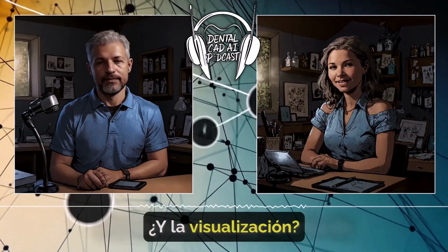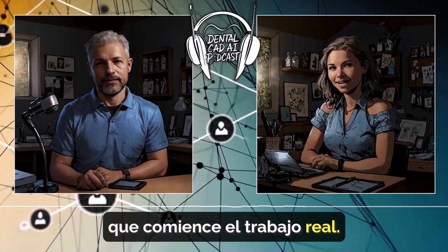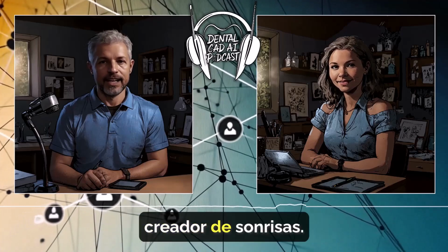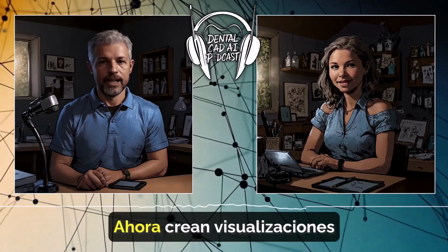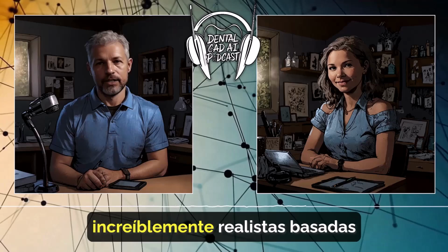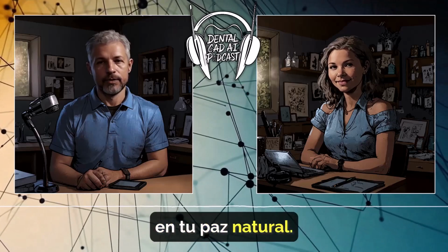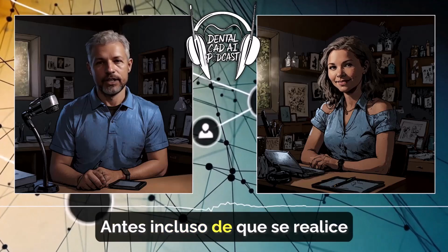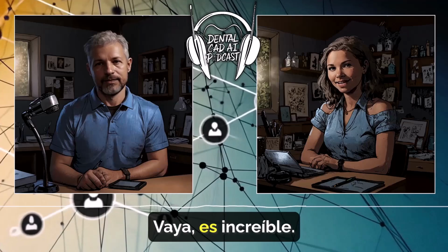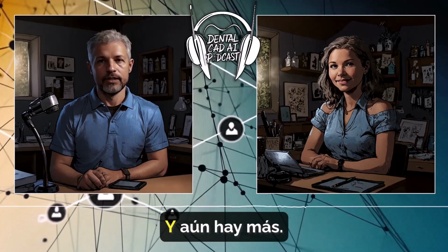And what about visualization? You mentioned something about seeing your new smile before the actual work begins. Oh, yes. So the Smile Creator has been enhanced. It's got these all-natural and all-distinguished modes now. What do those do? They create incredibly realistic visualizations based on your natural teeth. So you can actually see what your new smile will look like. Exactly, before any work is even done. Wow, that's amazing. I bet that takes a lot of the anxiety out of it. I think so too, and there's even more to it.